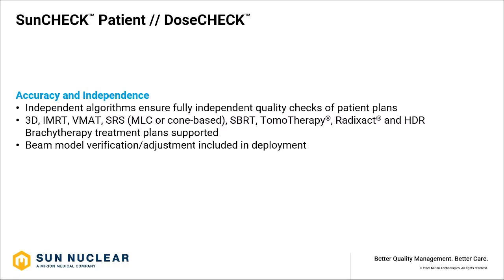DoseCHECK, which is part of the SunCheck patient platform, uses an independent algorithm to make sure that you are getting an independent QA check of your patient plan. So all 3D plans, including electron plans, as well as IMRT, VMAT, SRS, whether it's MLC or cone-based, SBRT, tomotherapy, RadixAct, as well as HDR brachytherapy plans are supported within the DoseCHECK platform.